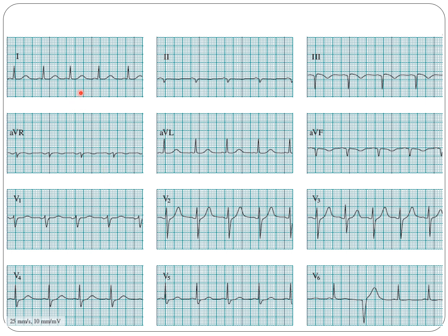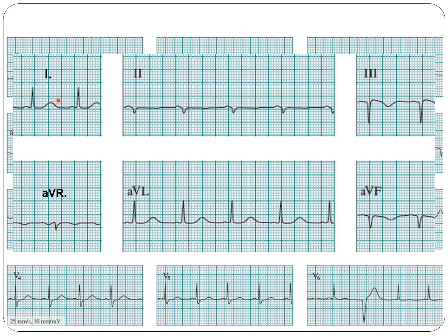In the next one, again, we do have rhythmic heartbeats. The rate, very similarly, 90. P wave is sinus, PR is normal, axis: 1 positive, 2 negative, extreme left deviation. AVR is negative, so this is between minus 30 and minus 60.